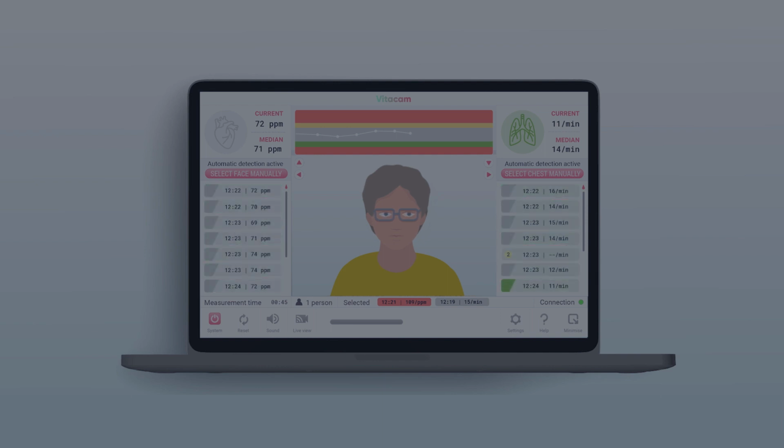The same color coding can be seen on the base of the trend. Through the trend, the user can observe visually how the values have changed over time. In situations where the system is not able to produce reliable measurement results, for example due to excessive movement, the result is marked as an empty undefined value, identifiable by an exclamation mark on a yellow background. If multiple undefined results are received in succession, the exclamation mark changes to a number equal to the amount of undefined.